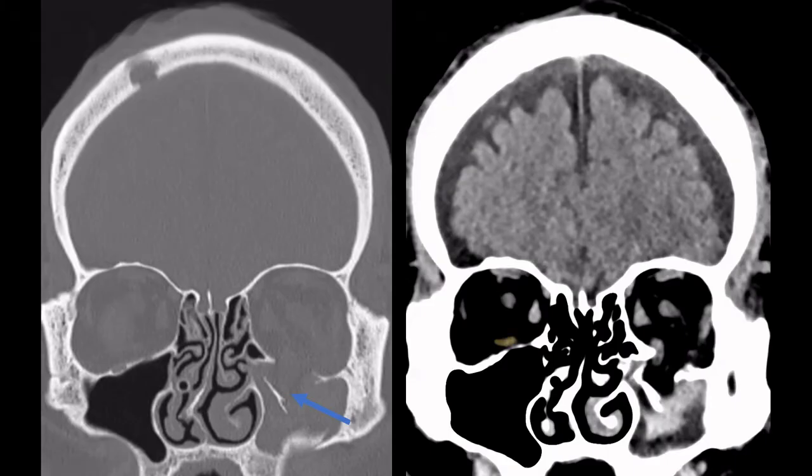This is a normal inferior rectus muscle on the contralateral side, and we see that on this side it has migrated partially within the defect caused by the fracture. This is an important thing to look for, and this is an important thing to tell your physician, because if the situation is not corrected, it can lead to necrosis of the inferior rectus muscle and permanent diplopia. So this can be a reason to perform surgery in these patients.